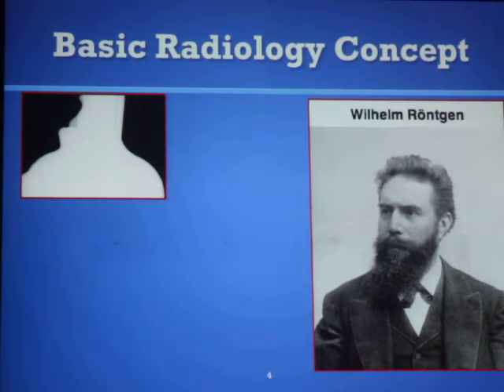But if you look at that screen, it does not make any sense to us because it's only one type of object exposed there, and it just doesn't tell us anything other than that it was of that shape.